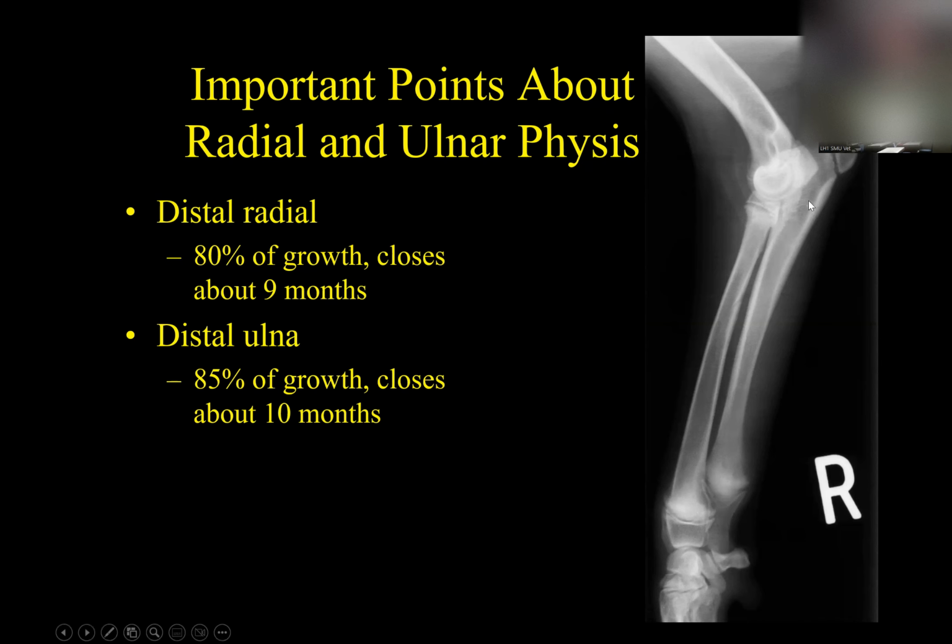Okay, so even though it's rare, if I was to damage this growth plate here or that one due to trauma, it's probably not going to have that much effect on the length of the radius and the ulna as the animal grows. If I damage the distal radius and ulnar growth plate, it's going to have a huge impact on the length of those radiuses and that ulna.